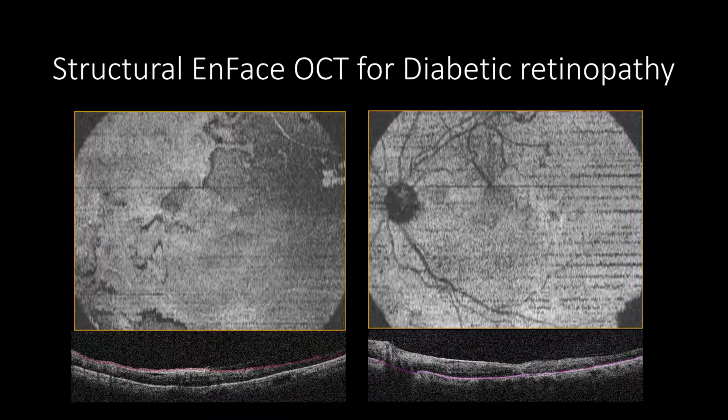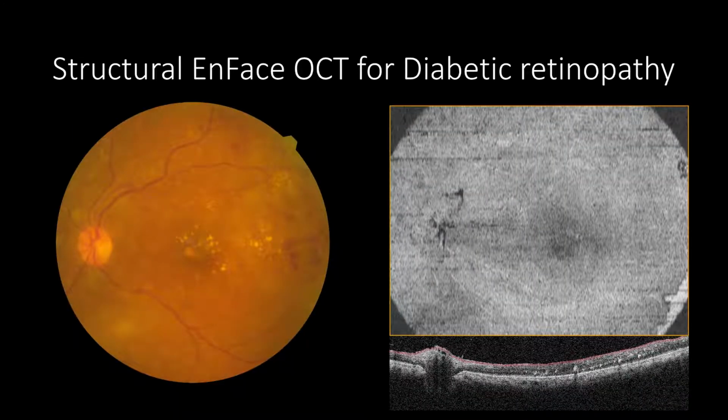In cases of proliferative diabetic retinopathy, the ILM slab will show a hyperreflective membrane corresponding to the fibrovascular tissue. Please note the segmentation artifact. In some cases, the RPE slab will show a projection artifact resembling the neovascular network. In some cases, the ILM slab may help recognize the fibrotic changes which may depict neovascularization.